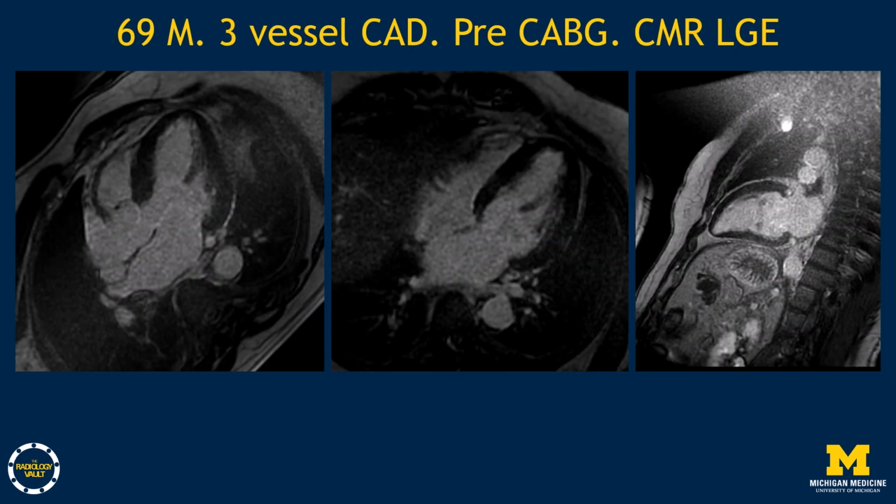Late gadolinium enhancement images do not show any enhancement. Notice the myocardium is well nulled. There are no bright enhancing areas. All this tells us that the myocardium is viable. It's likely hibernating myocardium, and functional recovery is likely.